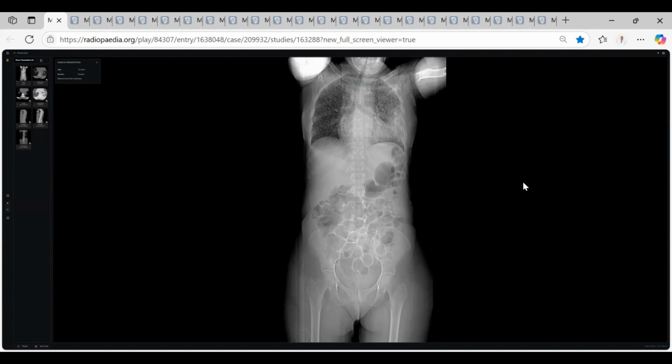Concentrate on the lung. Sir, can I zoom a little bit? It is very clear. In the lungs, I also noticed that there is slight mediastinal shift to the right side with slight widening of the mediastinum in the superior part. This is projection.